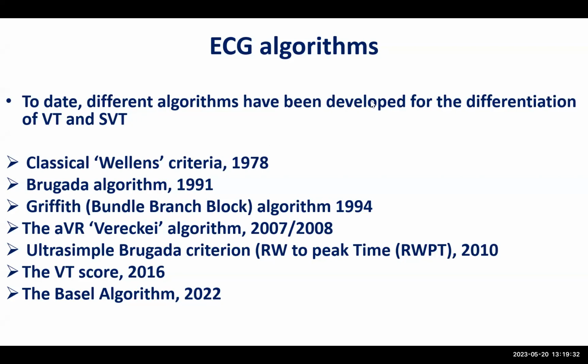I'll go quickly over them. Some of you maybe are using them in the emergency room when they see patients with wide QRS complex tachycardia, but you can see especially the classic ones, the Brugada and the aVR initial one, that they are a little bit complex and sometimes difficult to remember, but we have more simple ones. And then I'll go to what I usually do with the cases that I showed you before.